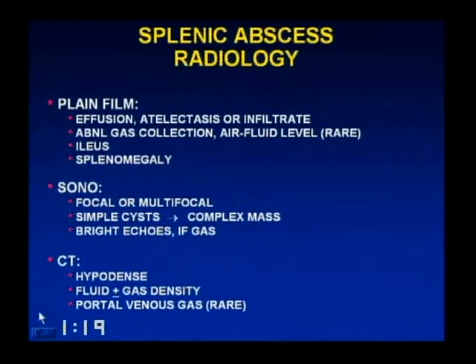And on cross-sectional imaging, it basically depends on, is this one abscess and what size? They're usually focal, can be multifocal.